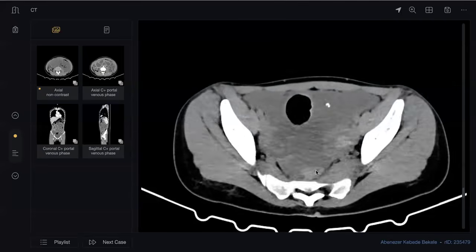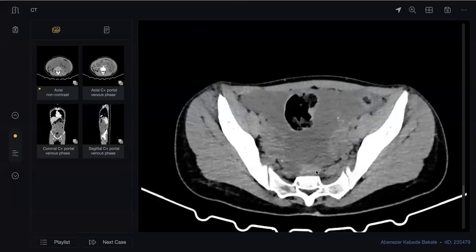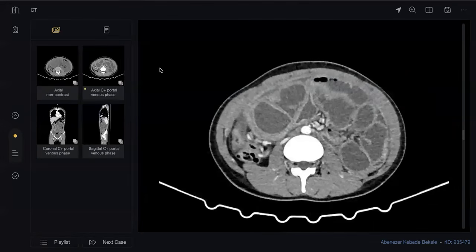So the multiple calcified foci within the abdomen, diffusely scattered, with ascites, raise one differential possibility of calcified lymph nodes. As these are diffusely scattered, I would like to see the post-contrast images for further evaluation. Yes, go for post-contrast. Yeah, sure.